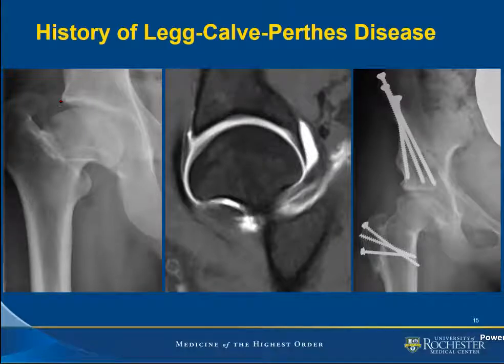So you imagine that they have the similar problems that we've been talking about. Here's the MRI showing Seldes type 1 chondrolabral junction separation right here. And I wanted to illustrate this case to show some of the surgical techniques. So as a surgeon, you want to debride back this bony bump right here to remove the cam deformity. You want to do a labral repair. You want to debride some of the articular cartilage if it's damaged.